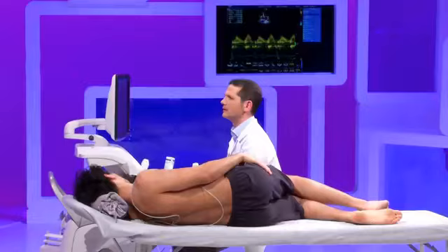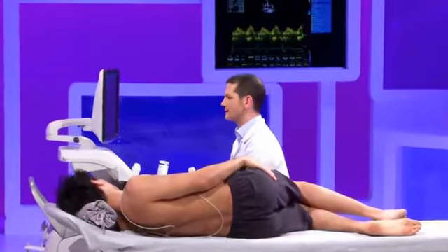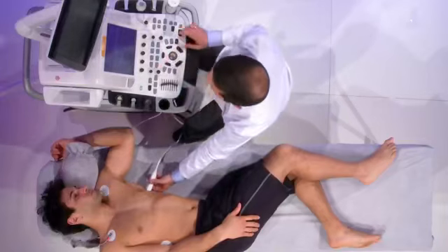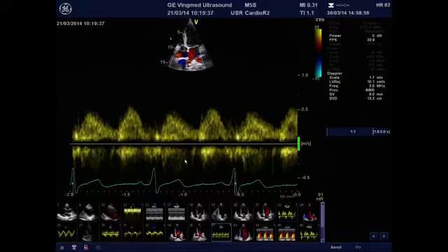So obviously another important thing that I didn't mention, when one looks to begin with at the structural aspect of the heart, of course we also need to assess the level of the ejection fraction, even if this is a systolic parameter and not a diastolic one, because based on that, some of the diastolic parameters will work better or not so well. Coming back to the pulmonary vein flow, the third wave that we discussed is the AR wave, and it is this tiny wave that you can see here.